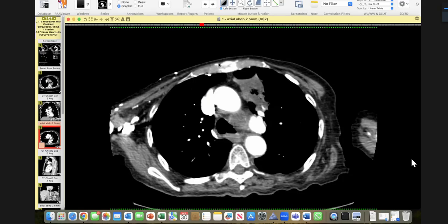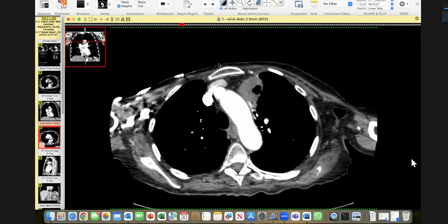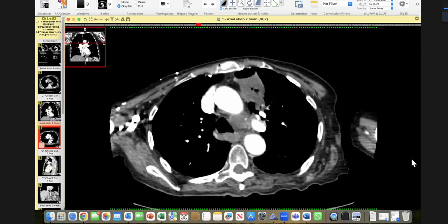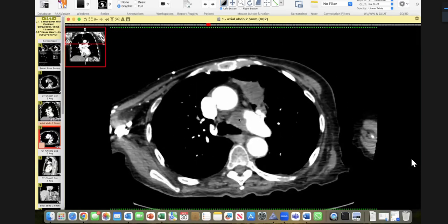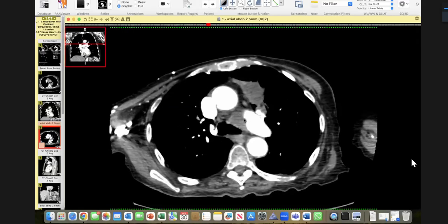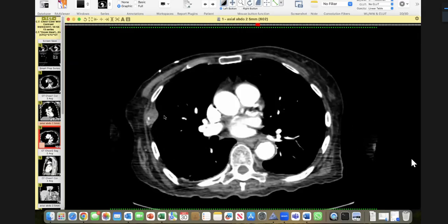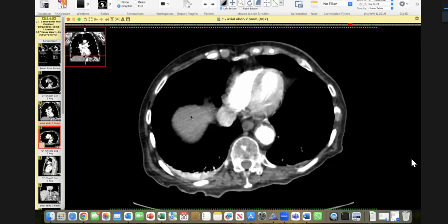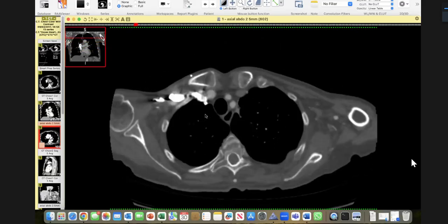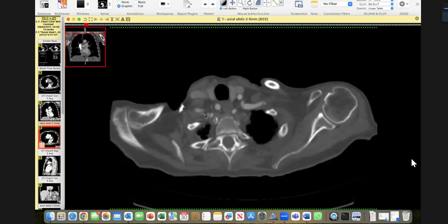You said, no, I want to first of all see everything and then I will ask for a window. And to look for the coronal, I was not at all interested in the coronal. I'm just looking at your knowledge; your thought process was absolutely fine. The point was taken. The main thing was something else, which you can see even here. Actually, you never went for the bone window because you took too much time there. And if you see the bone window, the main findings are on the bone window.